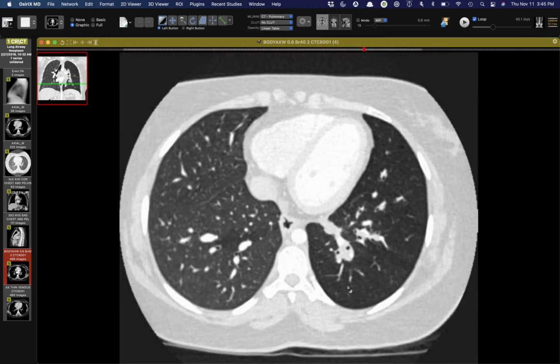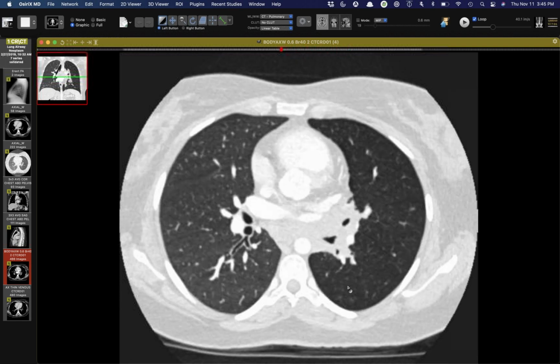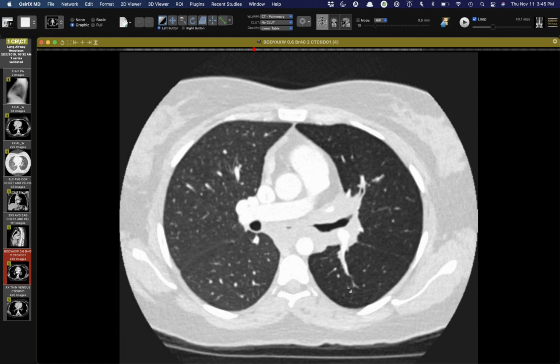I would think of neurofibromas as firm and rubbery, but it's almost like the tissue is growing in the connective tissue sheath of the bronchoarterial bundles and just growing down the sheaths. Well, that's what plexiform neurofibromas do. They just kind of grow along wherever you have nerves. But I thought this was quite the case. Oh my word.